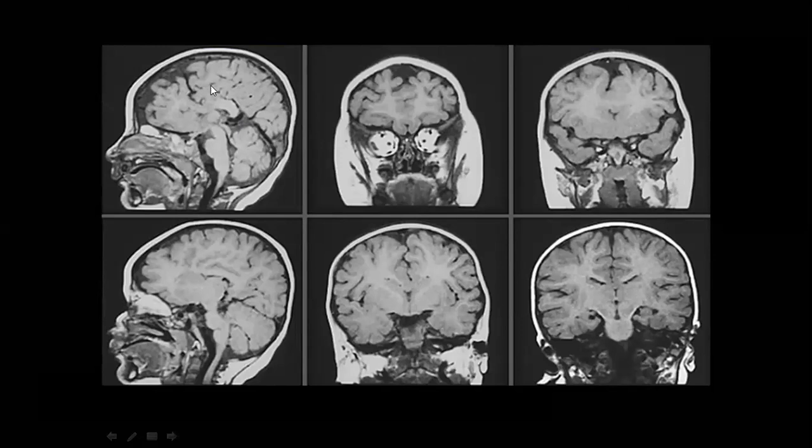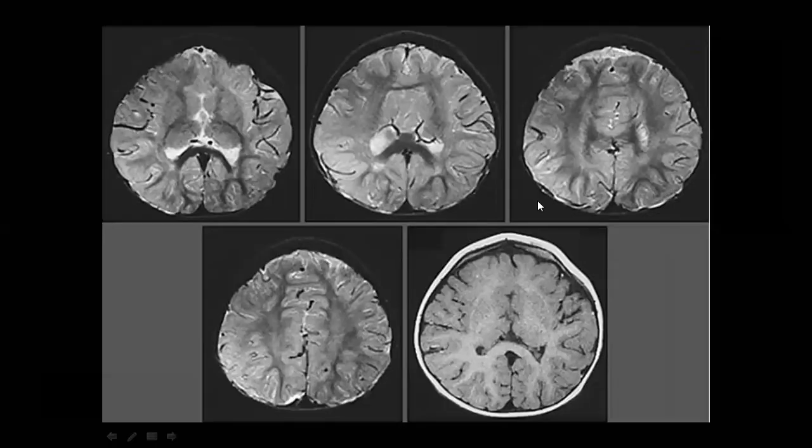Start here. If you find corpus callosum agenesis, you don't find the corpus callosum, then check for other manifestations. And here for Chiari, if you find the tonsils go down below the foramen magnum level, then you are talking about Chiari, and look which type of Chiari, Chiari 1 or Chiari 2 and so on. So as a good approach, try to start with this and go further with your checklist. They like this one, yeah.